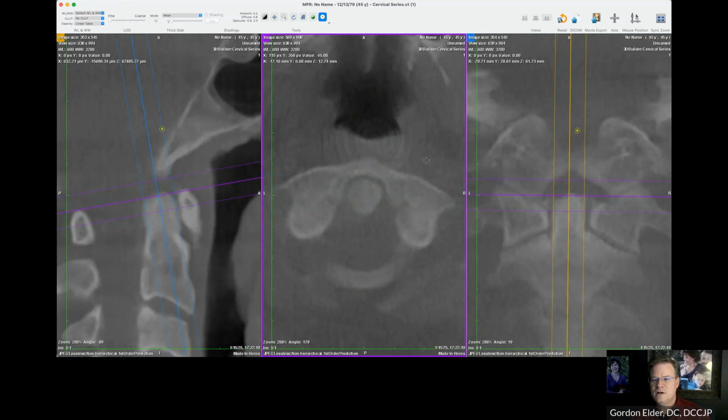I'm going to get rid of the crosshairs there for now. So what we're going to do is find the long axis of each of these joints. And Dr. Blair has come up with a procedure for doing so using plain film x-ray based on what can easily be seen on most patients, maybe not always easily, but can consistently be found on most patients. Because we cannot clearly see the joints on an x-ray, he developed it this way. We're finding some other points so that we can get close to what that long axis is, and we'll see why we need that in a moment.